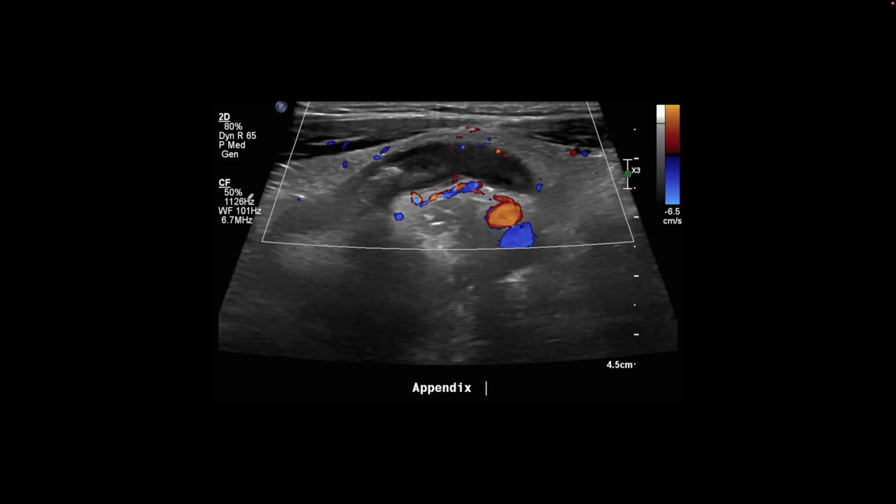Here's our next patient, a pediatric patient who presented with right lower quadrant abdominal pain. And this is one of those rare situations where we picked up acute appendicitis on ultrasound. And so we see on the single image with a color Doppler box on it, a hypoechoic tubular blind-ended focus in the right lower quadrant, and an appendicolith with shadowing, and there is mural hyperemia, all consistent with acute appendicitis on ultrasound.